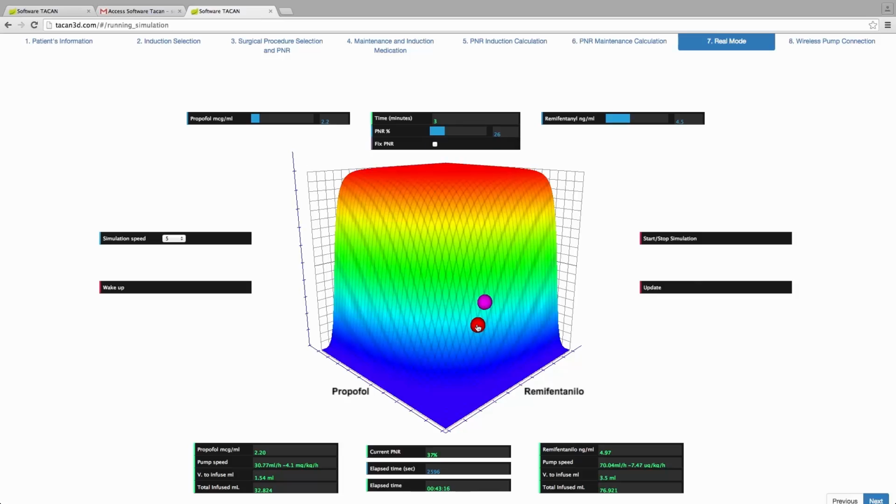TACAN 3D, a very versatile software where the anesthesiologist can locate a point in space as a function of time. This point in the space selected by the anesthesiologist will depend basically on the variables of anesthetic depth, nociception variables, such as systolic blood pressure, heart rate, or nociception rates, and the experience of the anesthesiologist. With these variables, you can locate a point in the spectrum of the surface model, which is dynamic and allows finding an ideal plane in a more objective way.